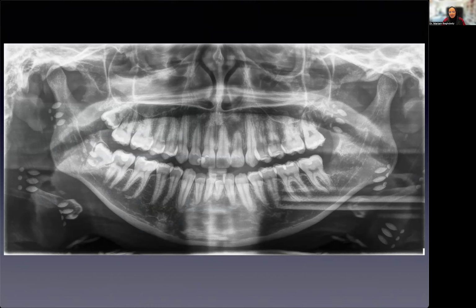But can anybody think about what this error is? This is a fun little one. Can anyone imagine what this one is? So this is metal, metalish.